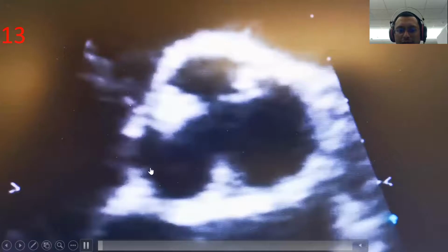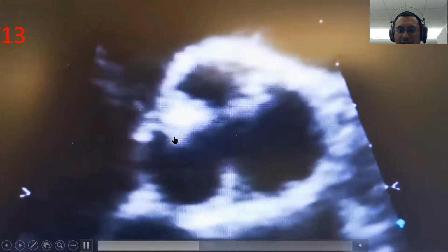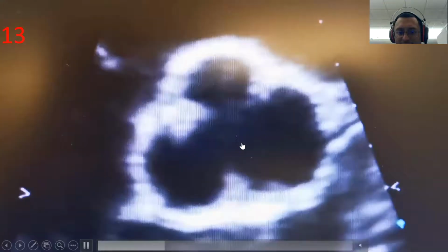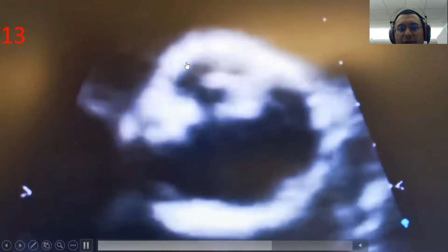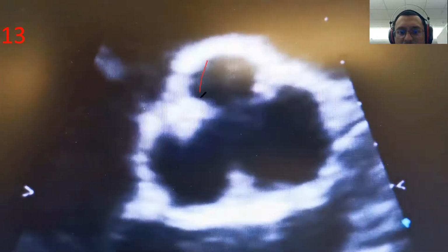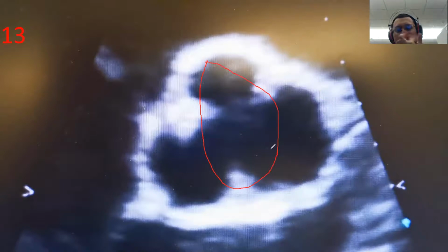Okay. So all this here is a single valve, and then it opens here. That's a single opening. Now, in a patient with bicuspid aortic valve, it should open like this. It should extend to the rest of the heart. And this is hemi-elliptical. That's how a bicuspid aortic valve looks. Bicuspid aortic valve usually has only one raphe.